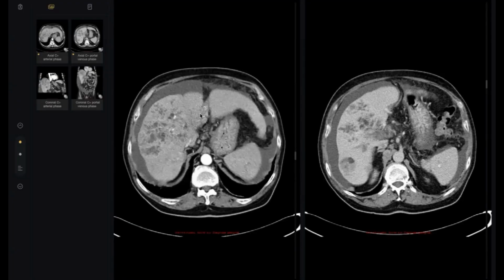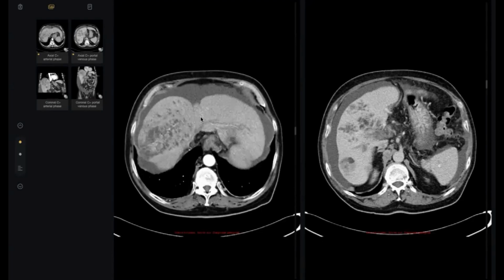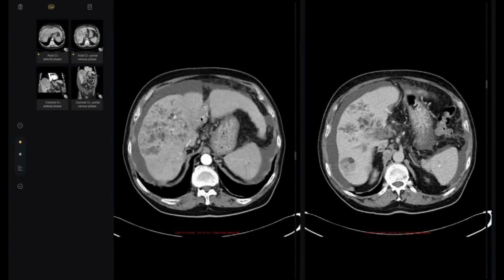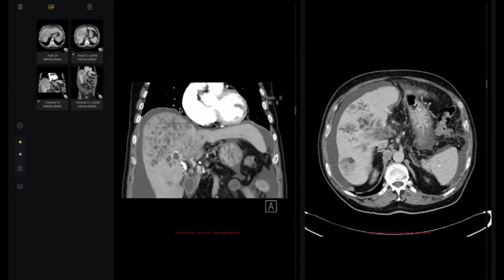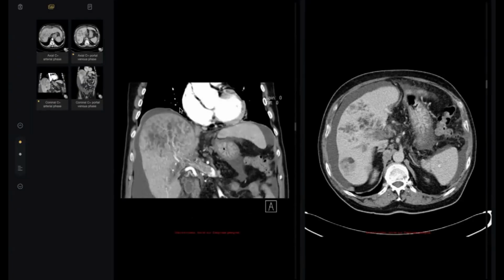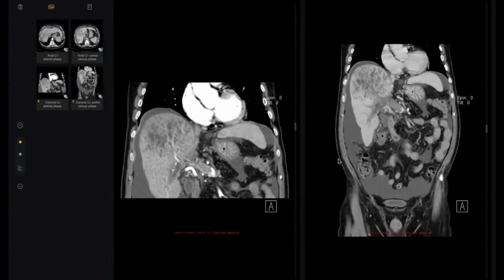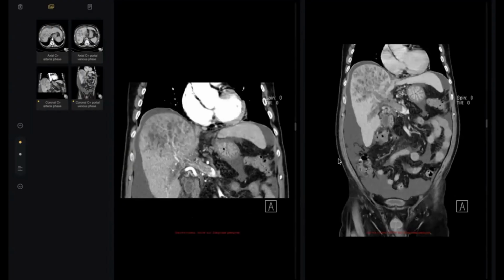Okay, very nice. Give me the conclusion, please. The conclusion: I have been presented with a cirrhotic liver that showed a huge mass lesion. Also, I can see areas of hyper enhancing lesions within the arterial phase, which could represent regenerative nodules. The liver size is enlarged. Appearances are those of hepatocellular carcinoma with secondary portal vein thrombosis.